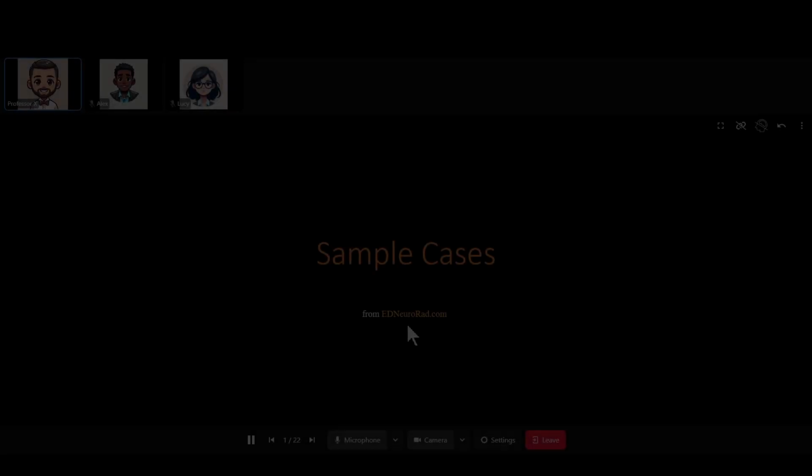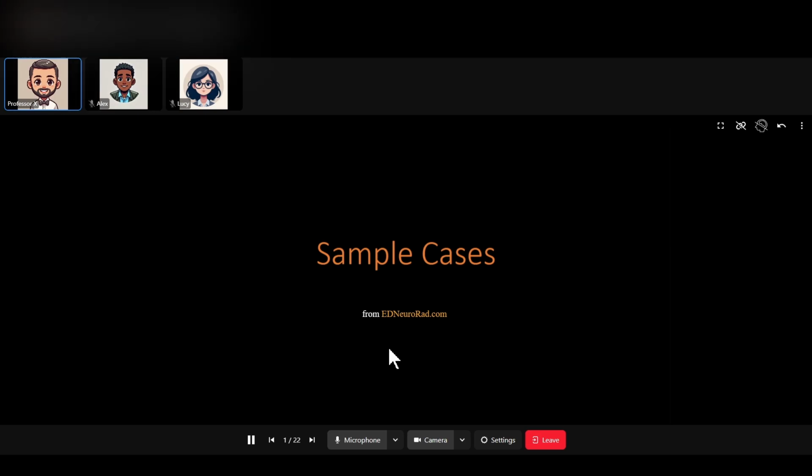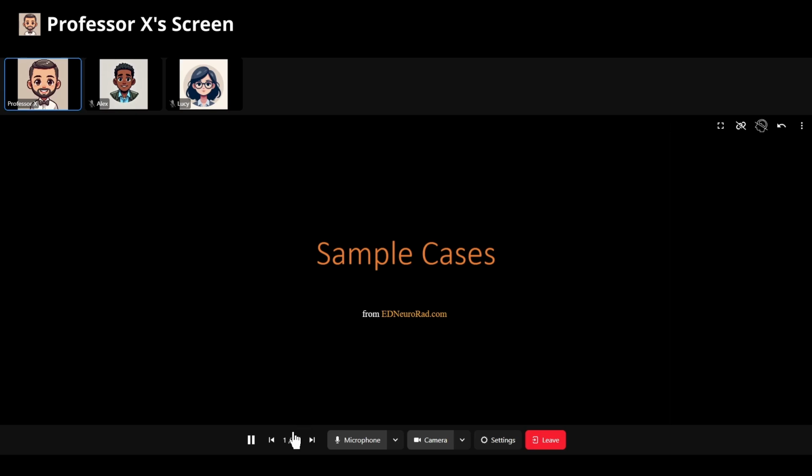In this tutorial, I will go over how to use the conferencing features of RadPPTX. First, let's see how the typical conference might look. In this demo, Professor X is giving a case conference to Lucy and Alex and will ask them to take cases. Good morning, everyone. Let's start our case conference.